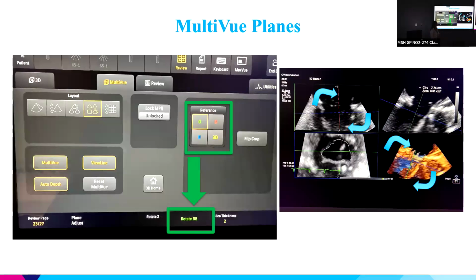Okay, so I'll rotate the green box to wherever I want. My goal for this particular example is to have the blue at the mitral valve leaflet tips because I'm trying to measure a mitral valve area. That's what I'm trying to do here. So you can see that I'm going to rotate this one so I get the posterior leaflet in and the anterior leaflet in.